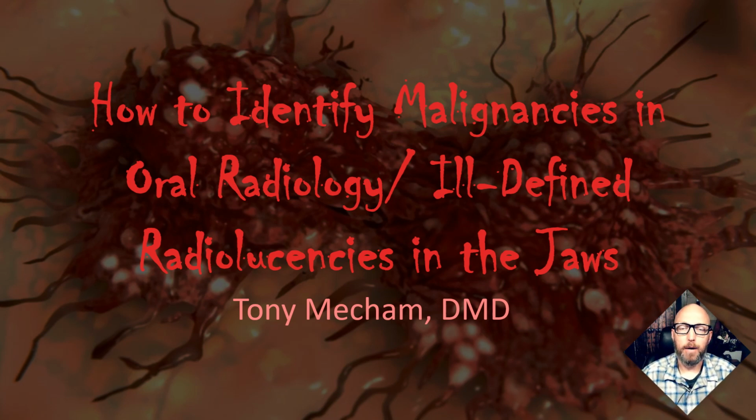Today I'm going to be talking about how to identify malignancies in oral radiology, and specifically I'm going to be introducing ill-defined radiolucencies of the jaws. So if you haven't watched already, look for the Principles of Interpretation lecture, which I'm going to record. I haven't recorded that yet, but that does go through the basics of distinguishing between benign and malignant types of lesions in the jaws. And this one I'll go through, like I said, mostly malignancies, but also we need to talk about acute osteomyelitis, which can appear just like an ill-defined radiolucency in the jaw, so that can be very difficult to distinguish from a malignancy.